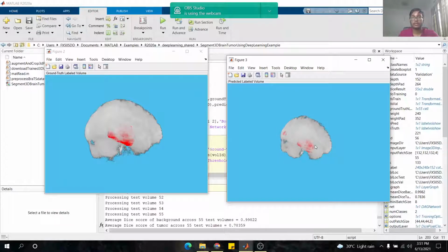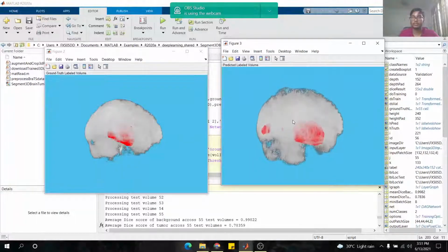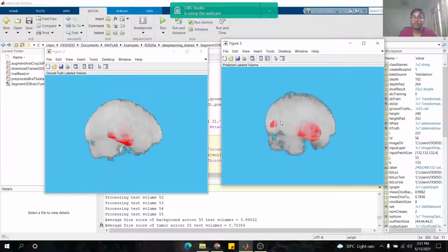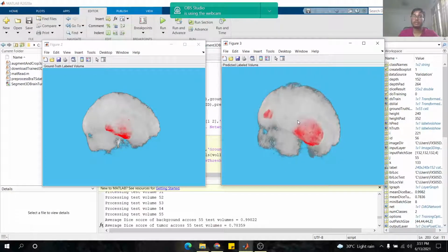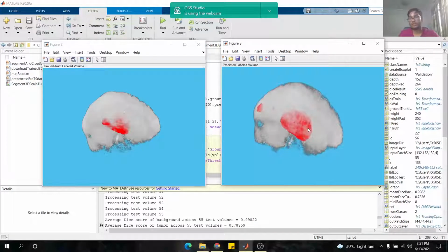In the predicted element, it is able to detect also, but at the same time there is a bit of bugs and whatnot. There's also a little bit of data loss because the data which I used became a bit corrupted. As you can see, we have a bit of inaccuracy over here because the tumor is just at this region and not at this region.